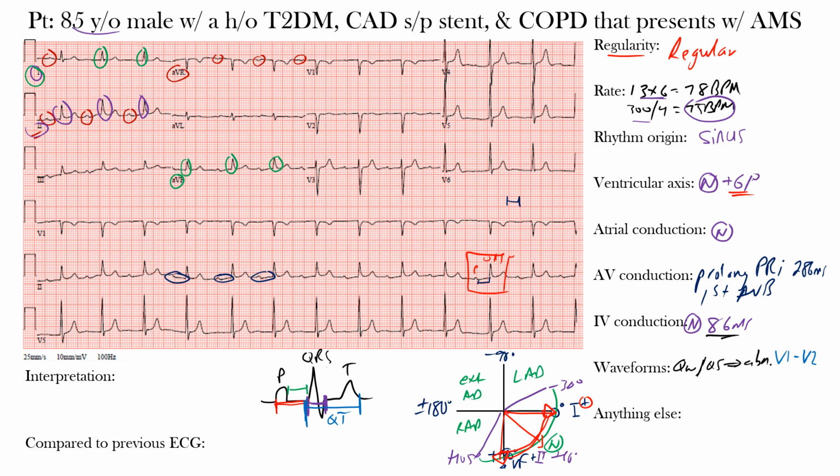So notice we were talking about these Q waves, all right? And when we talk about R wave progression, we want to see an R wave from V1, okay? The R wave should increase in amplitude from V1 through V5. We can barely make out, and this is likely not an R wave, here in V1. The same thing in V2, so no R waves already, and then you finally get a true one here in V3. Here's an R wave. And you can see it getting steeper and steeper with the leads that follow. So this is what we call an abnormal or poor R wave progression.